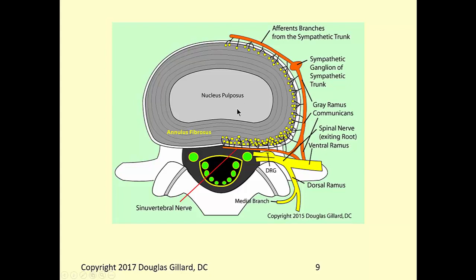So what happens typically is this disc rips open, and you get a rip in this disc. The nucleus squeezes out, gets into here, and irritates these things. Nucleus pulposus, usually when this is called an annular tear, a grade 3 annular tear, is a rip all the way through the disc, also called a full thickness annular tear. But black disc or degenerative disc on T2 weighted imaging, the cells, when they're dying, they secrete cytokines like crazy, especially one called tumor necrosis factor alpha. And that's like gasoline. It's like pouring gasoline on here. And it can cause horrible pain. Sometimes you have to decompress the disc with a fusion.